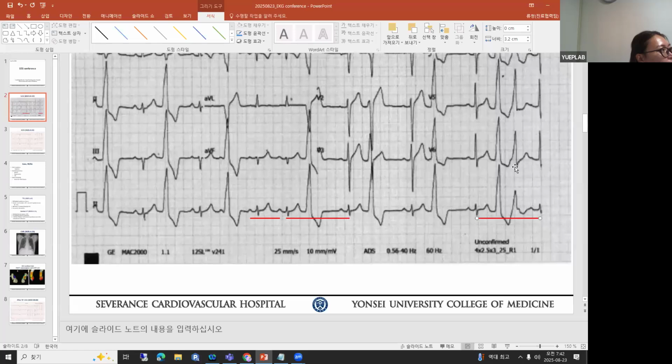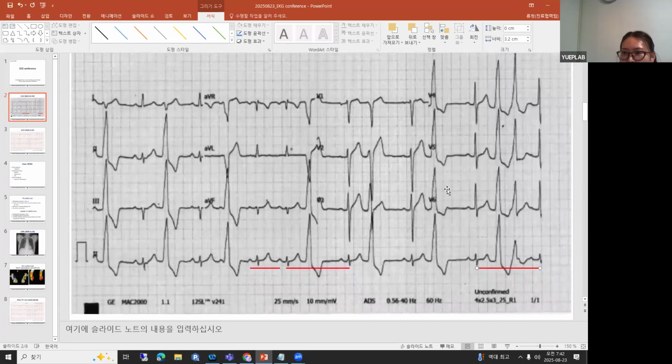But the question is what happened here? That is an issue because you have another P wave hidden here somewhere. So the question is whether you have some nodal input coming down to the partial refractory conduction system that can cause this, yes or no? You could never prove it. But it is too short to be conducted. I don't think it's too short. It's long enough.